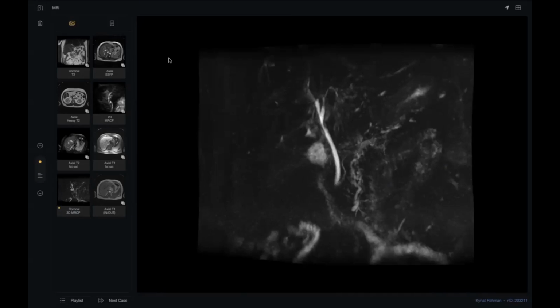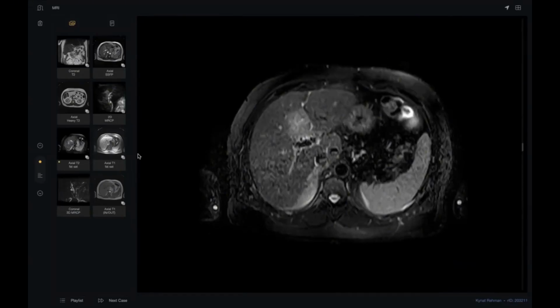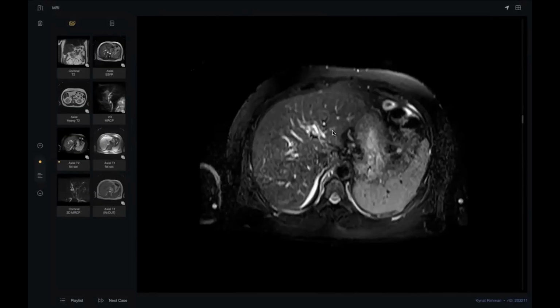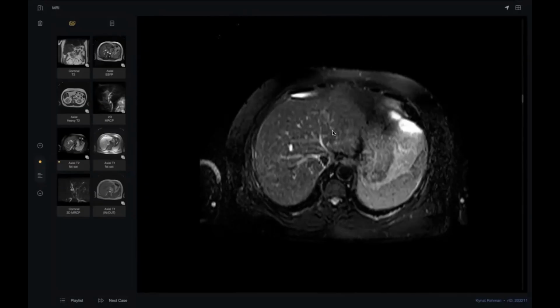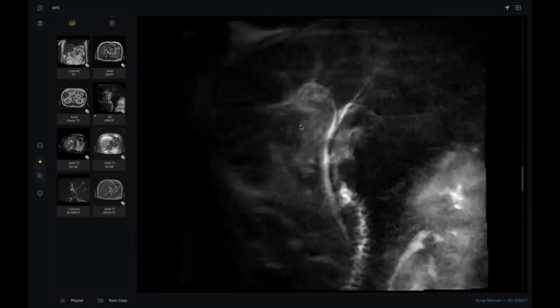See, doctor, one second. You see our pathology here, and you describe it well. When I give you something else, don't destroy the previous finding. Build up on it. See, there is narrowing here, and what about this? What is this? Is this the same? Looks like yes. So what happened here?